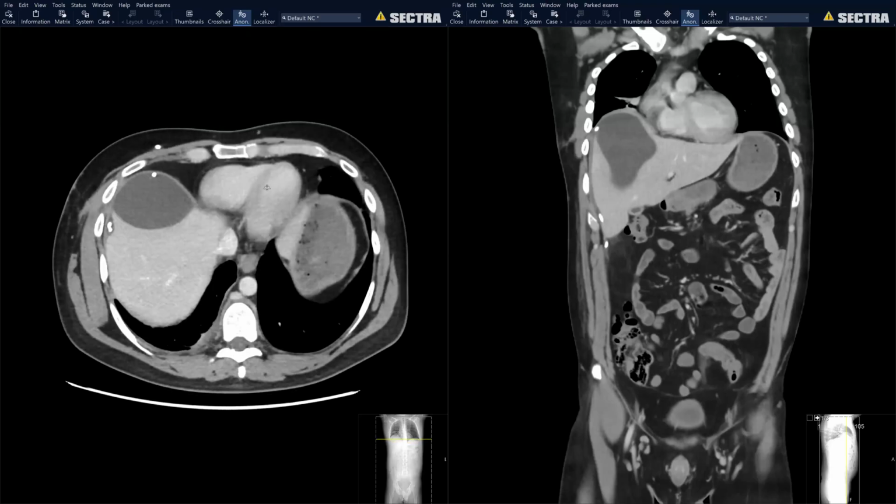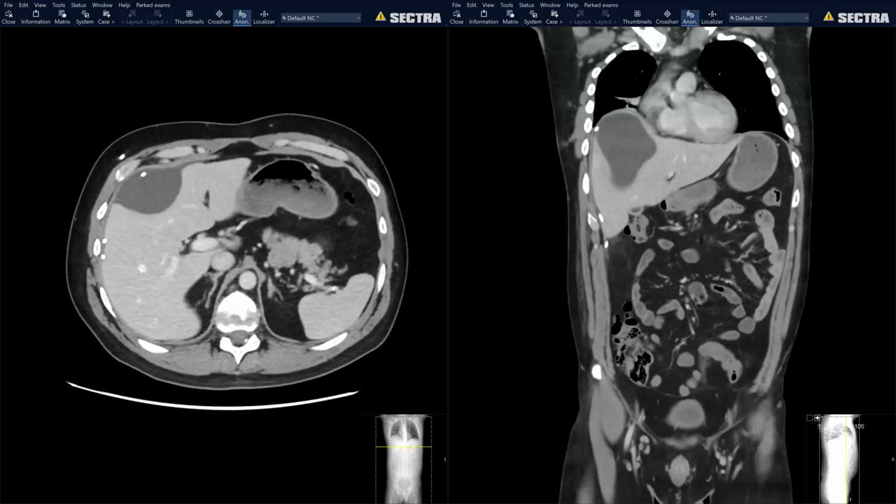This is a wild case, Aarti. When we showed it in our interesting case conference, somebody had just had another case of it. So I guess they always come in pairs, but it is pretty rare. Usually the bone is quite resistant, although you can always get it in the vertebral body. It's more common in the vertebral bodies. This is even more rare. And no history, just.